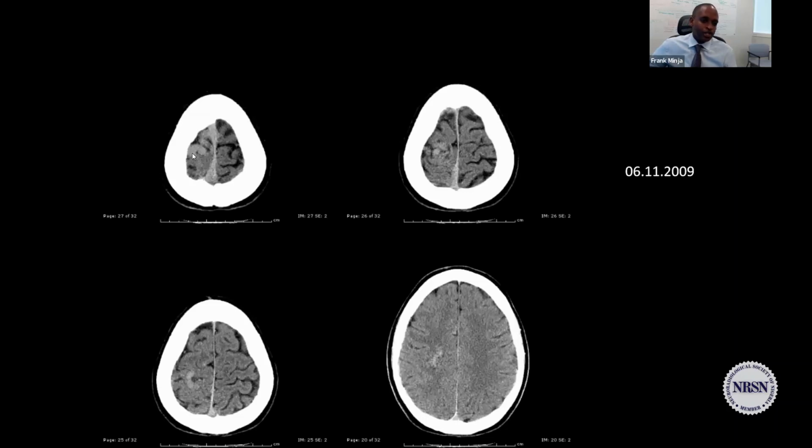This is serpiginous, right? It looks like a little worm. It looks like a little snake, right? That should remind you that you're probably looking at a cortical vein, right? Anytime you're talking about something that looks worm-like or snake-like, the word you use should be serpiginous. And as soon as I say serpiginous, that should trigger that, oh, I may be talking about a vascular lesion.